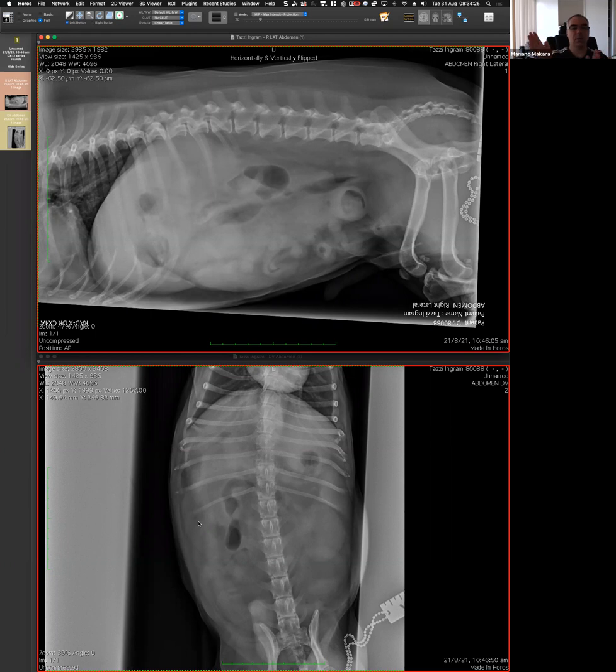So what if this is very oral? And now I'm going to unfold what I think. So what if this is duodenum? It's on the right. I think I can connect it with this. This is going too cranial, too much on the right, and I think I can follow that line. If not, I pretend, but everything fits in place if you just assume this. If this connects with that, and this connects with this, then this is the only portion of the GI tract that is distended, which is the most oral portion of the duodenum.